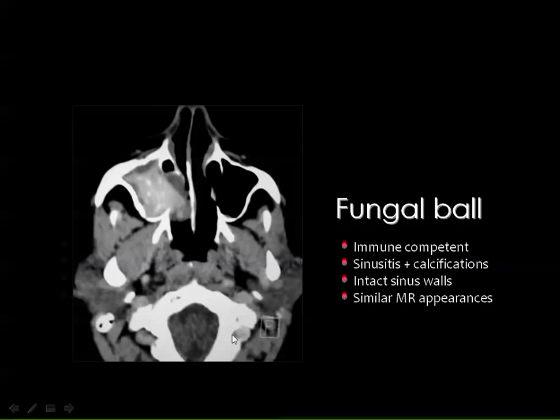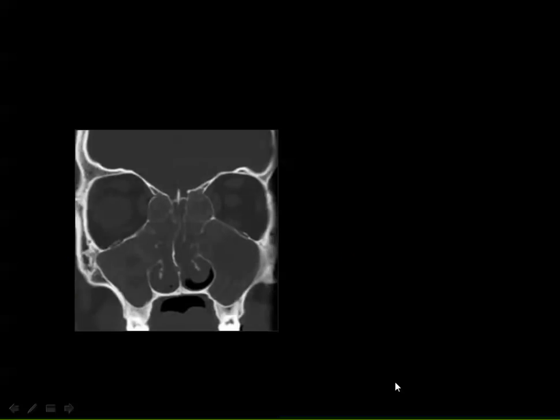Then this is fungal sinusitis. This is the ordinary secretions, and this is the fungus itself. In order to diagnose fungal ball, you should see some calcium inside the fungus itself. And if you detect calcium, you think of fungal ball.